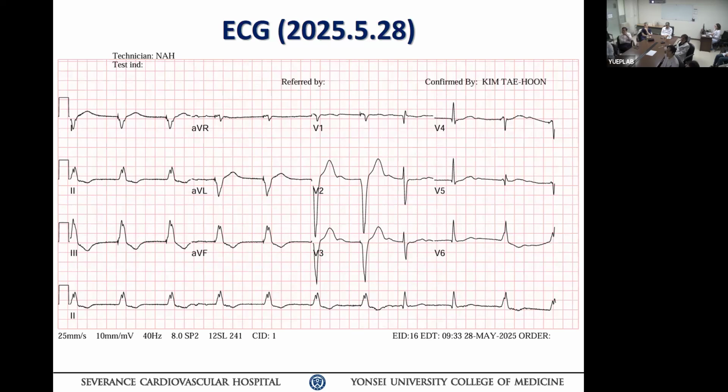Now, if this was septal pacing, CSP, these are very popular. Is this a good placement? That's the next question I'm going to ask you, because a single chamber pacemaker could be CSP, or could be just a regular pacemaker, right? What do you think about this ECG of a CSP? Is it good?